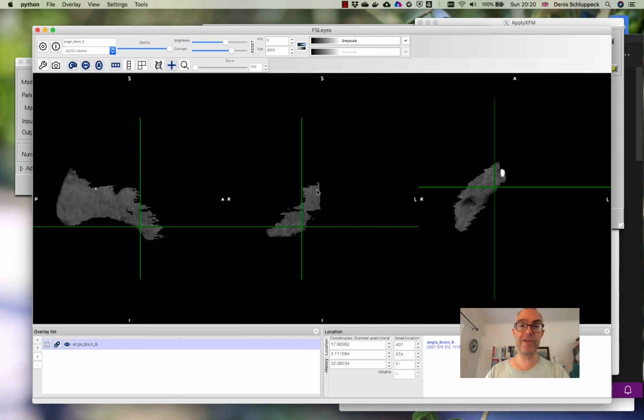So in the follow-up video to this, I'm going to jump into MATLAB, and what we're going to do in that particular video is try and break down the arterial tree into its structure, how things are connected and whether connections between certain parts are intact. Again, this will lead us to this idea of skeletons and graphs.